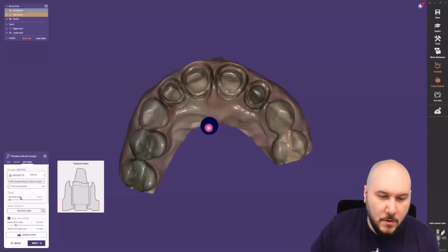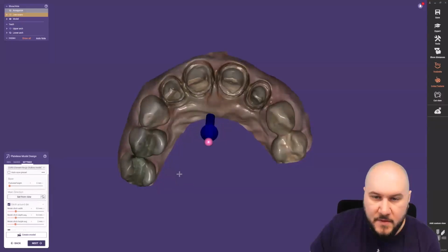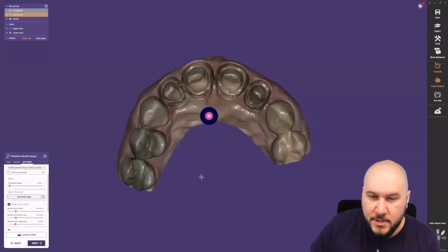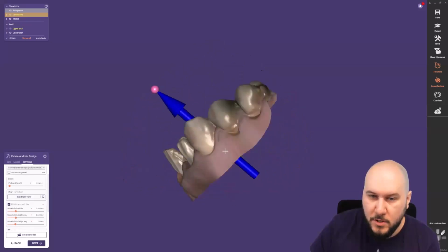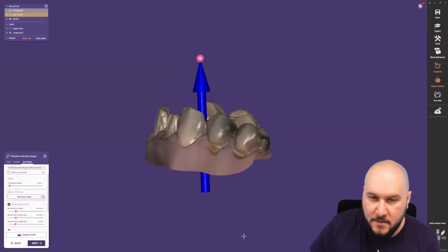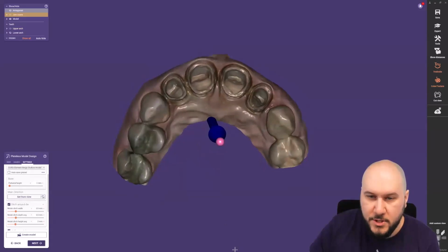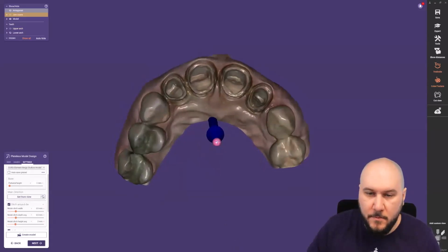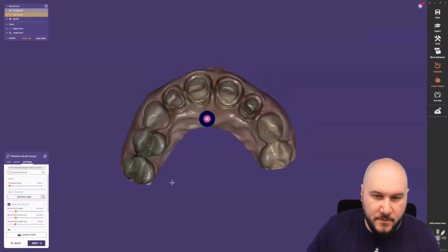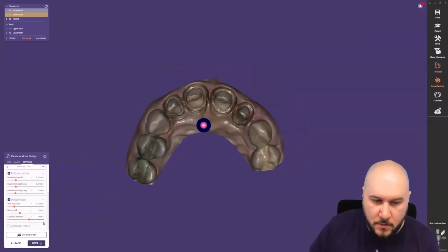Also the pedestal height here, set direction from view. This is also a thing like here. We can just move the model type a little bit more or less in this case. Just go right here, for example. But it's also the same, you can move it in whichever version you need. So I think we will just check it like here. So it's the direction from view. So feel free to play with that hollow model and so on.